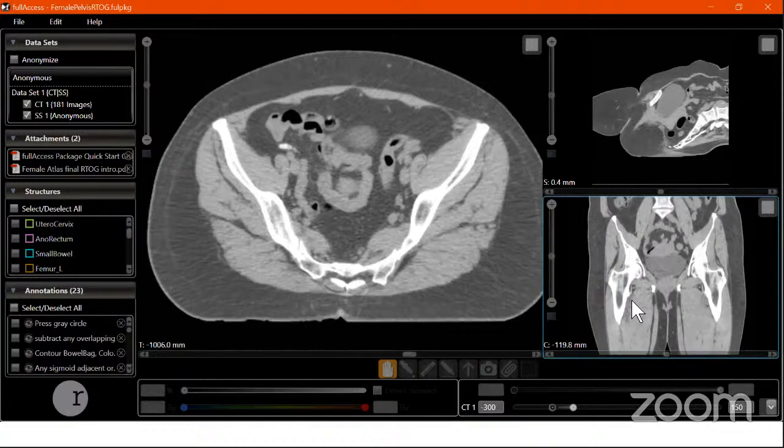The lowermost part extends up to the lesser trochanter. So we would have to contour for the vertical group as well as for the horizontal group. These are the two groups that you contour when you have to include inguinal nodes.